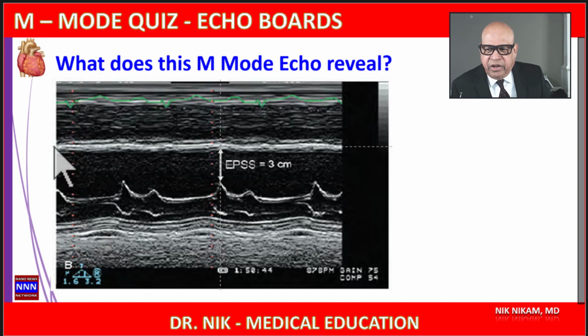First of all, there is decreased thickness of the septum. There is increased right ventricular volume. When we say increased right ventricular volume, you have to know what is a normal right ventricular dimension in an M-mode echocardiogram. Here we have 1, 2, 3, 4 centimeters. The normal dimension is something like 3.2 centimeters of the right ventricle. Your septum is practically flat and it is also thin, which may suggest there might have been a previous septal infarct. And if you look at the posterior wall, even the posterior wall motion is considerably reduced.